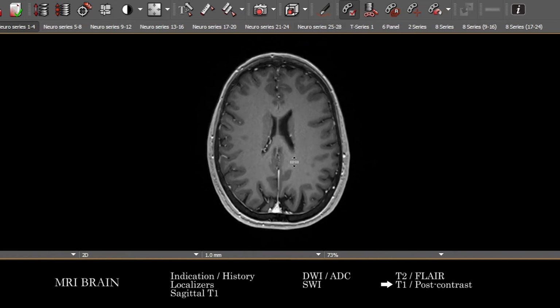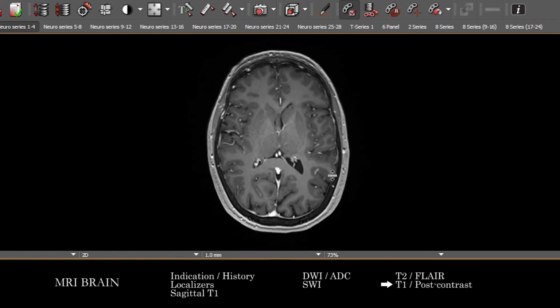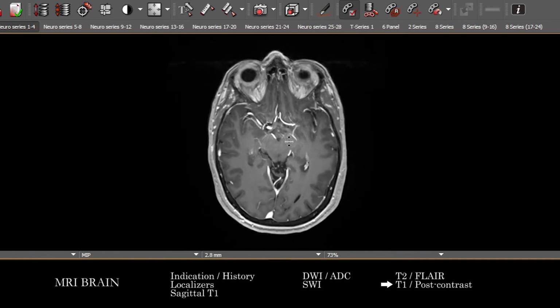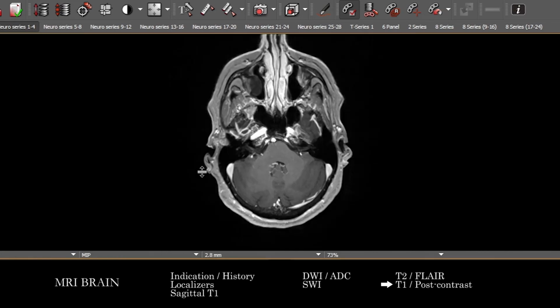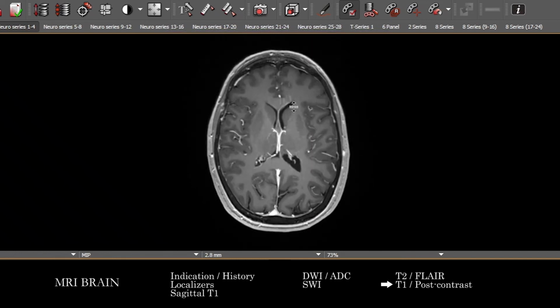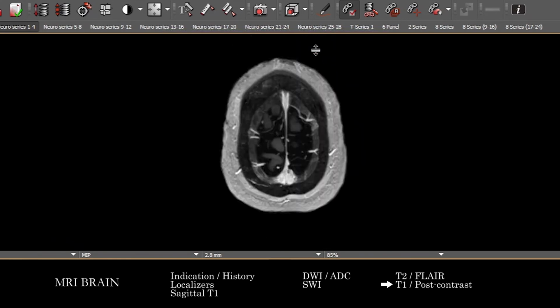Going through the extracranial soft tissues, osseous structures, and then ultimately looking through your CSF spaces, and then ultimately vessels, making sure that you are, and now I've mipped up these images, making sure you take a quick look at the vascular structures for incidental aneurysms, incidental thrombosis or filling defects in the venous sinuses, and then I like to use the MIPs to look for small, subtle enhancing foci within the brain parenchyma, or also abnormal leptomeningeal, pachymeningeal enhancement.